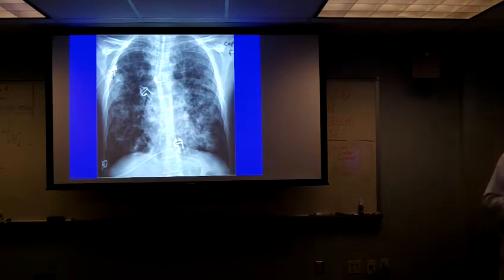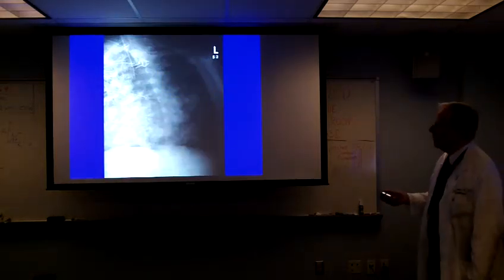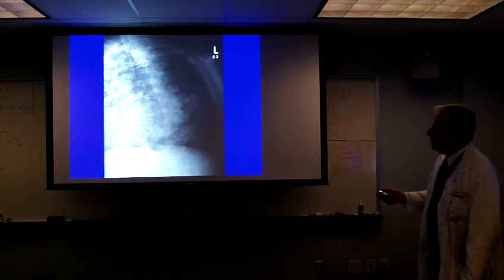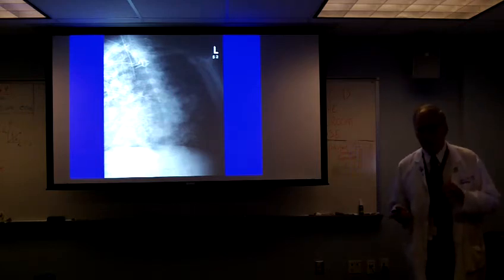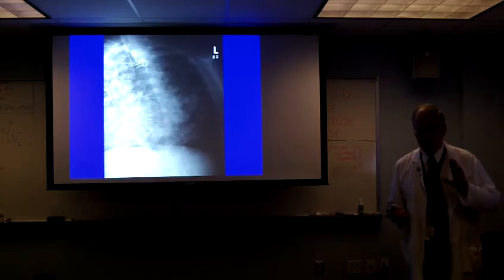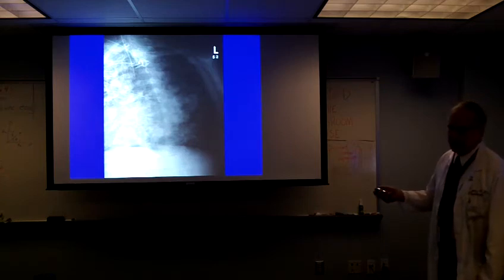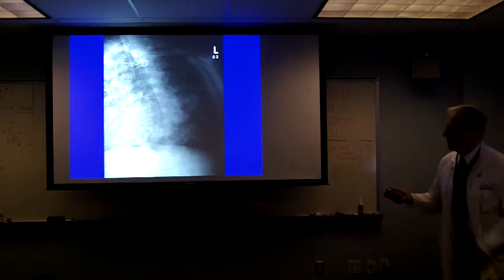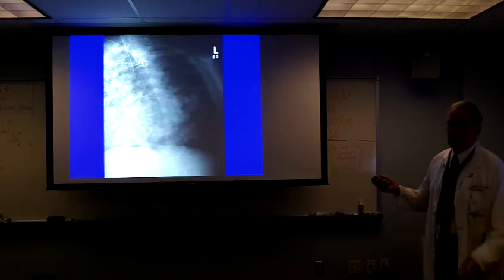So this is what I had the technologist do. I had them shoot an LAO, so you can see here is the endotracheal tube, and there is the feeding tube. And this is the image that I would have recommended in that feeding tube protocol rather than an AP film. Because if you shoot this, if it's in the airway, it's going to project right over the endotracheal tube. If it's in the esophagus, it's always going to be posterior. And so even if the radiopaque tip is proximal to the end of the endotracheal tube, you'll still know.